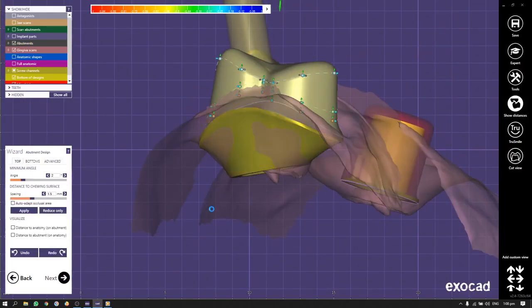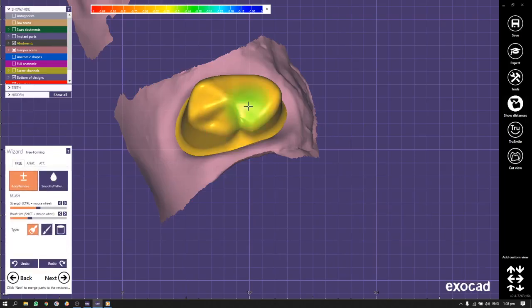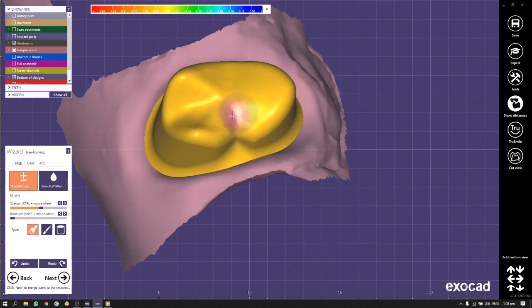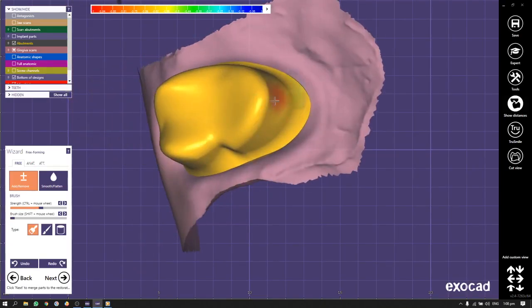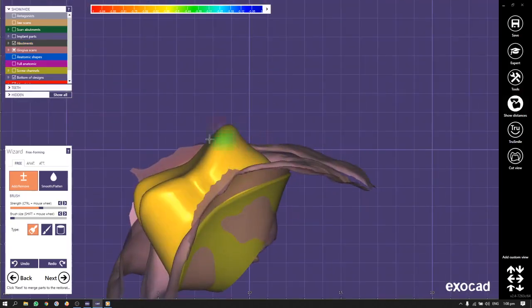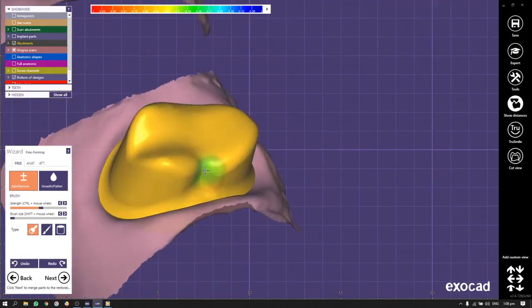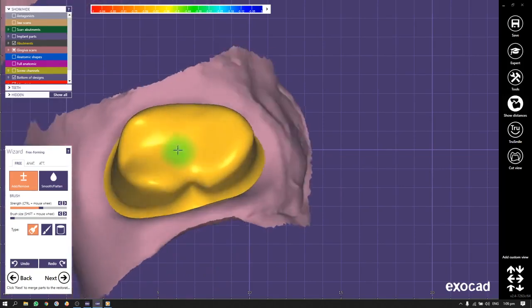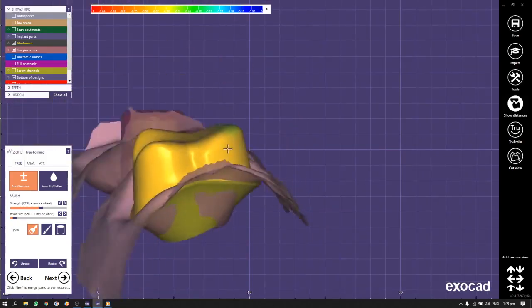We go into the step of additional correction of the abutment. Here we can remove part of it to make it not so high, to create more space for the antagonist. And you don't need to smooth the walls, otherwise we'll lose this axial inclination. Some artifacts are present, but here we can remove them if we just move this line to the left and right.